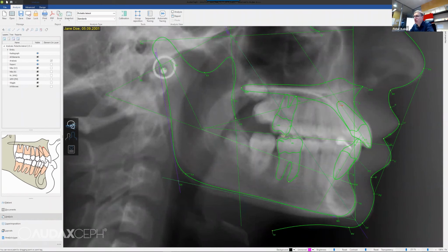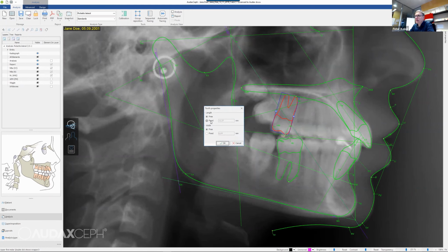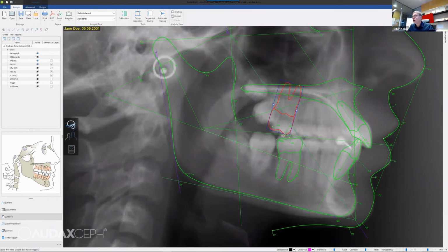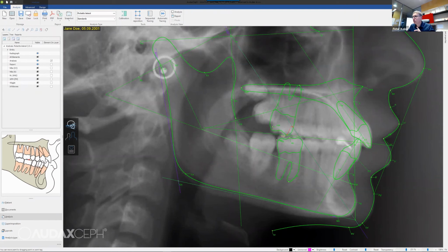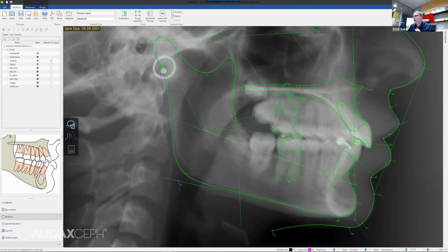And another thing, if the analysis is calibrated, we can have tools properties here. So we can say it is not this size. You can get these measurements from the panoramic image. If you measure the panoramic image, you can see that this is, I will exaggerate, 20 millimeters. Now, the problem is that you will only be able to place it like this around the other point, and in this case you are able to drag the tooth, otherwise you will not be able to move it. So you can select the cusp of the molar, select the size, and it will be something like that.